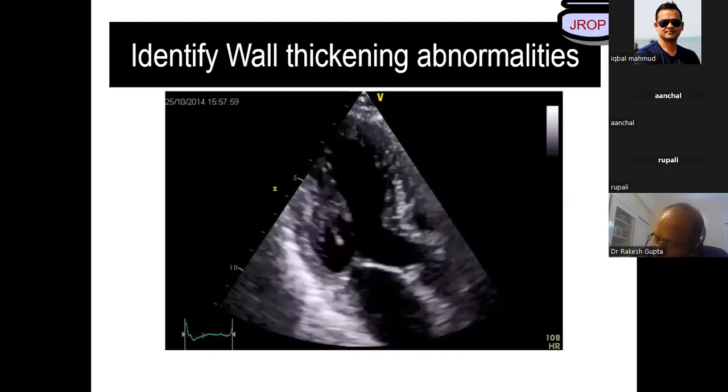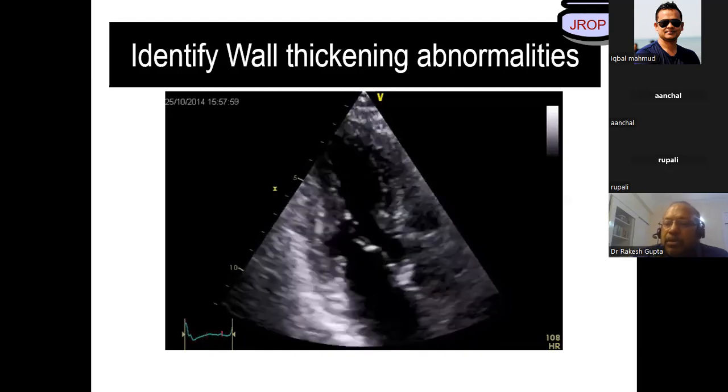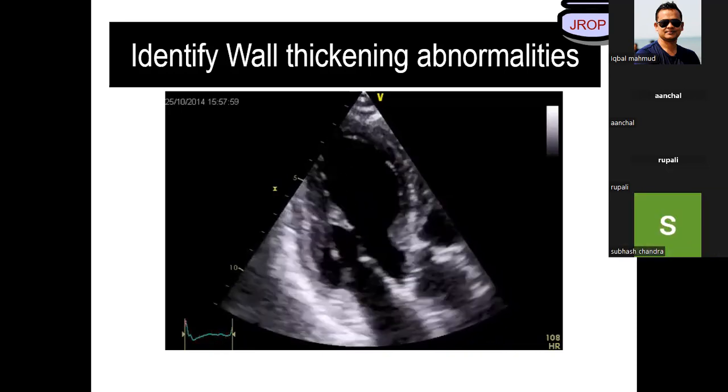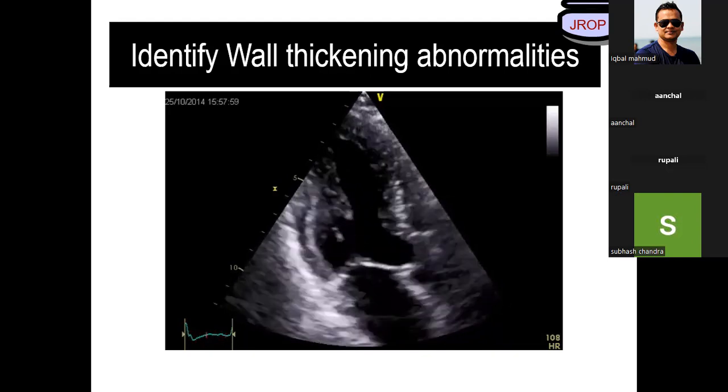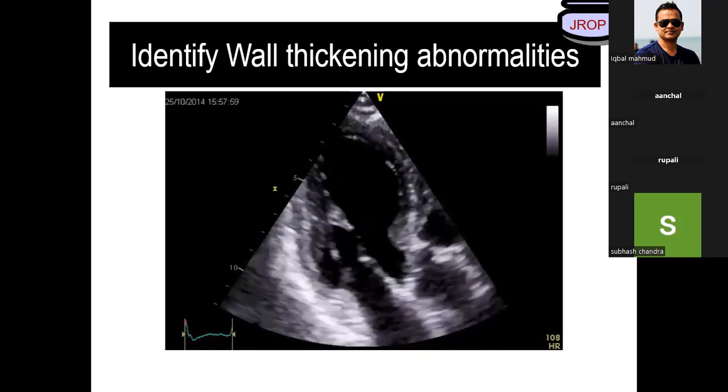Sir, can I try? Dr. Mohammed Iqbal. Yes, sir. There is some extra beat, maybe some extra systole or something. Otherwise, no. Okay, that's not true.